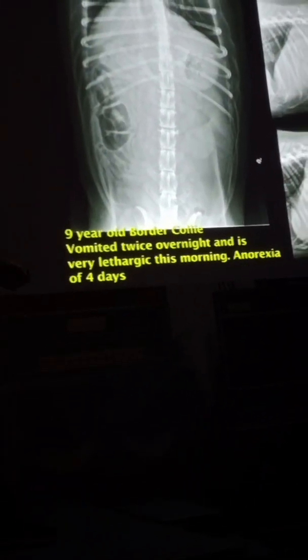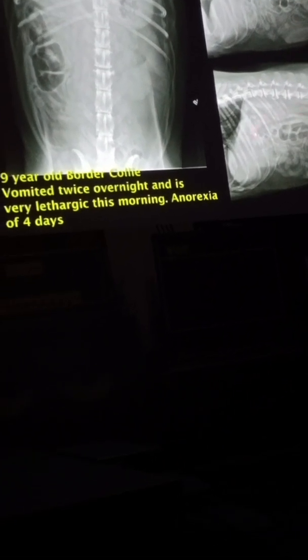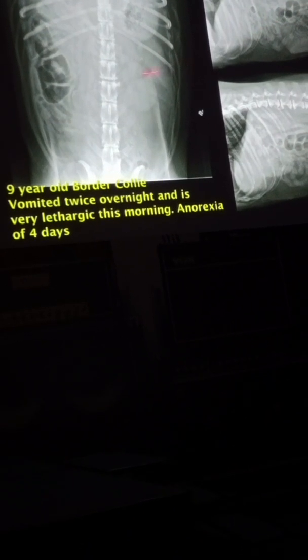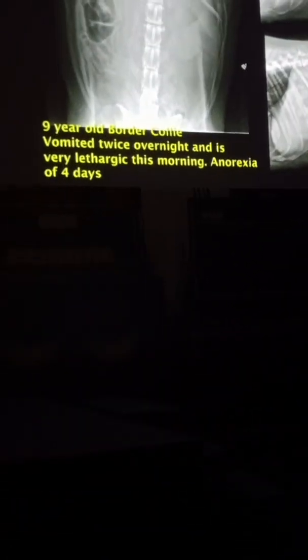That bothers me. Now, at the same time, beware. What's this? It's the cecum. What's this? Cecum. What's this? Don't think that small intestine is obstructed. All right? Now, I'm just magnifying it. This is my last case. Last case, okay? Look at the material in the stomach. It hasn't eaten for 4 days. Look at the pattern of material.